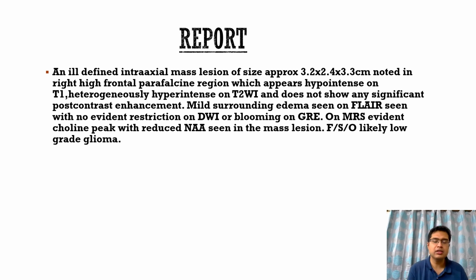Whenever you think of the possibility of a low-grade glioma, always get an MRS done, because this is a very important investigation as far as any tumor or neoplastic etiology of the brain is concerned, because it helps us differentiate. There is another case that I have presented on FCD, focal cortical dysplasia, where the MRS did not show a choline peak, and it was actually a cortical thickening, and postictal edema was present in that patient.